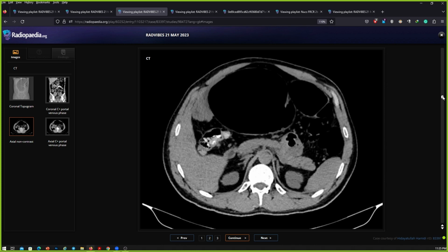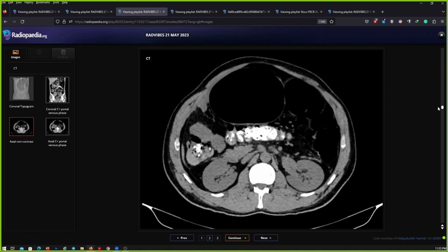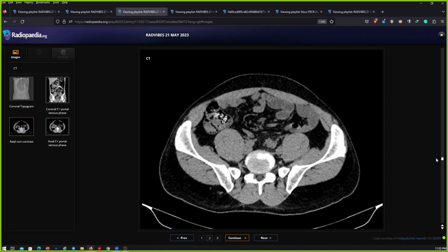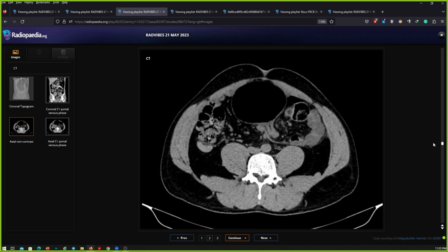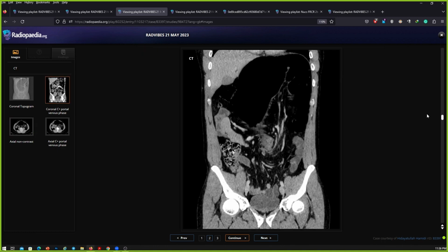Okay, why cecal volvulus? Where is the twisting? Sigmoid appears to be the... Okay, the twisting has started from the sigmoid. I'd like to revert my finding. The dilated bowel loops are starting from there. In my routine practice, I'll also have to look in the coronal section.